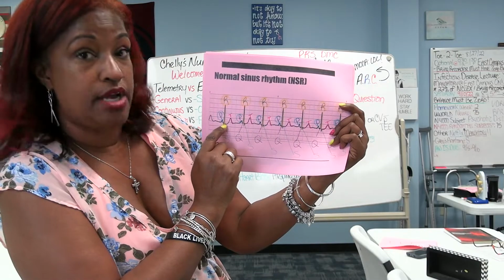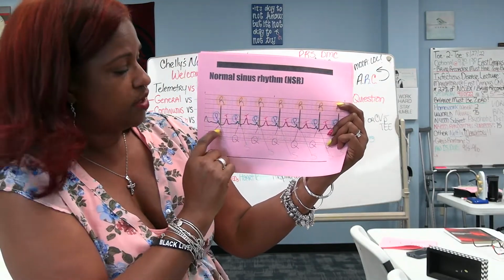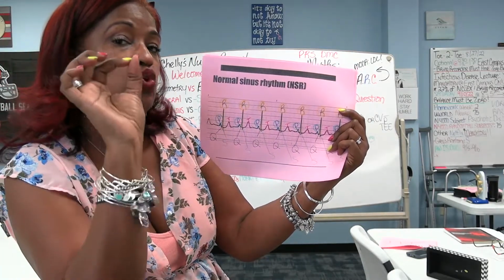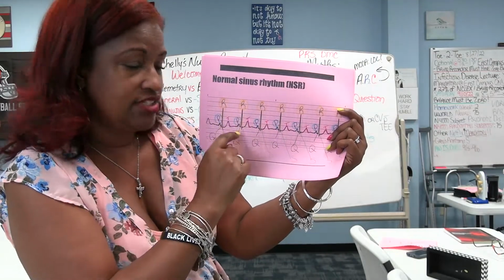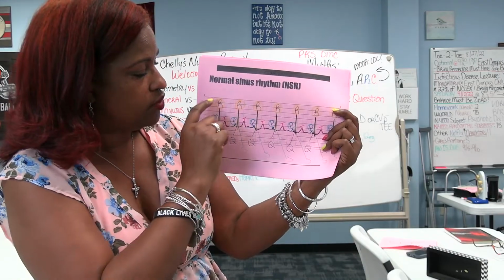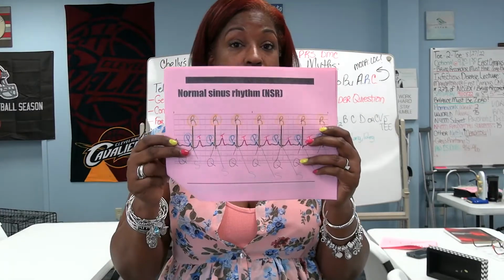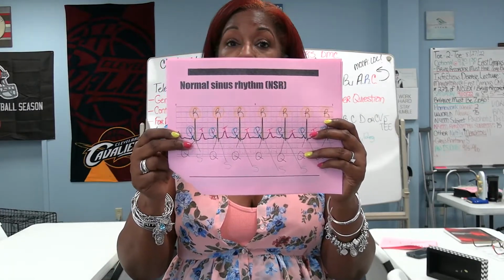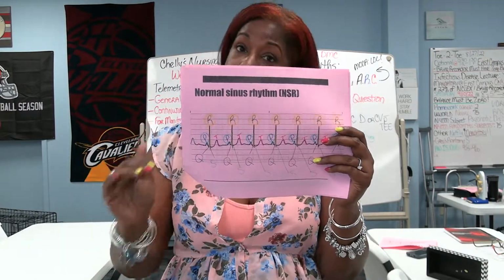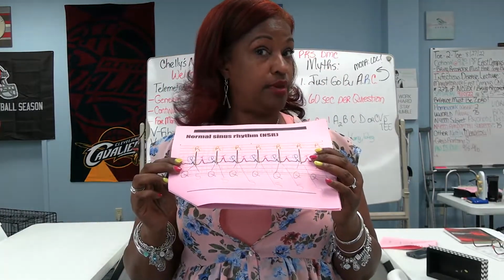P is very much immediately before the QRS, and the R is at the top. So what's down here? A Q. Where is it? Right as the QRS starts, or this R zigzag pattern starts, that's where the Q is. So you have your P, your Q, your R, and then you get a little bit of a break. It's not like with the P up against the QRS. There's a little bit of a break, and certainly the R comes down. When the R comes down and hits the baseline, it's basically called an S. Yes, that'll be important later.